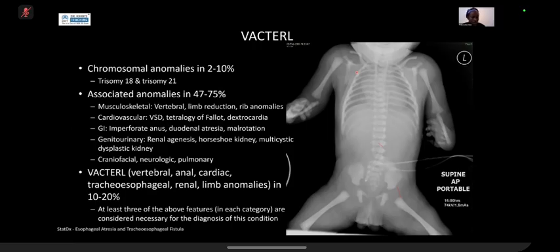I just wanted to mention the UVC and the UAC. Neonatal chest radiographs tend to have multiple lines in situ. So as candidate 3 did there, you need to assess the lines and check the positions first before you then go on to present the pertinent findings in the chest or abdomen.